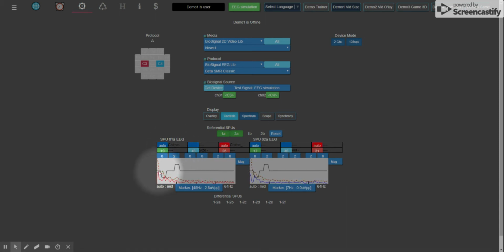The protocol profile is the black line along here. In the frequency domain, 0 to 64 Hertz, it indicates positive deviations frequencies there contribute to rewards, and negative deviations contribute to inhibits.